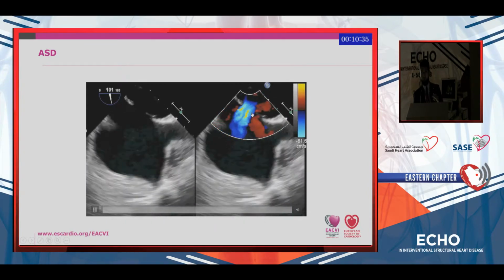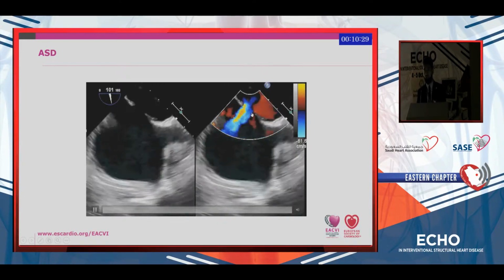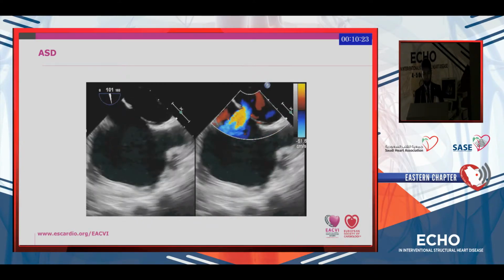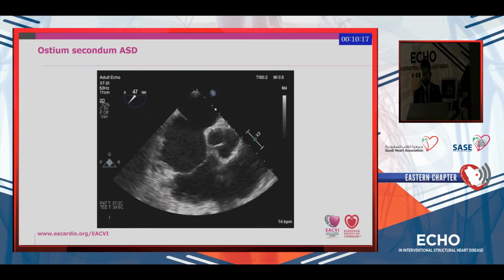So do not get caught. All of us make this mistake. Sometimes even in infective endocarditis, you see a mass on one of the valves, that's it, and then you forget another mass, another ghost hiding somewhere inside the heart. So this patient had a PFO as well as an ostium secundum ASD. The 0 degrees, 4-chamber view is also very helpful.